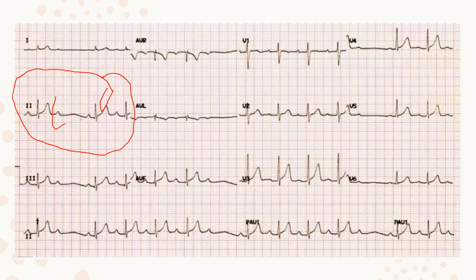Here's the P wave with no QRS, and then you pick back up with a normal PR interval right here. Then we're going to have a little bit longer PR interval right here. And then if we saw the additional part of the strip, you would see a drop, okay? So let's look at a longer strip. It becomes more obvious when you see a 6-second strip.